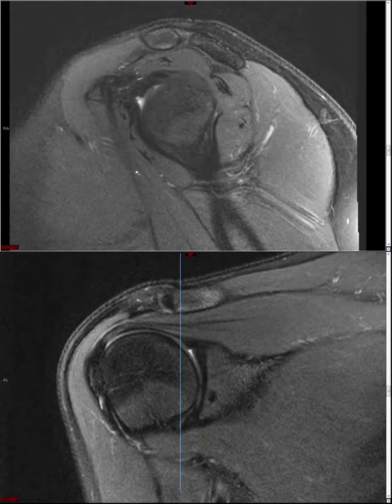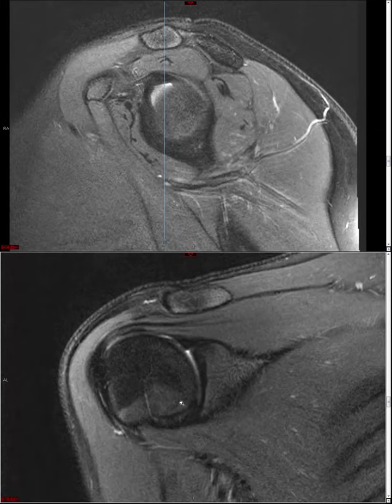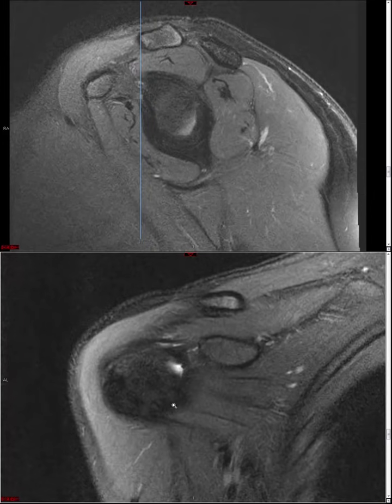with the subcoracoid bursa. Another good explanation is someone attempted an arthrogram, and so as I was saying, you put your needle down on the medial humeral head, but let's say you didn't have your needle right down on bone and you're actually a little more superficial than it should have been, then quite conceivably you deposit a whole bunch of contrast into the subcoracoid bursa rather than going into the joint. And how that would look on fluoro for those of you who are about to undertake shoulder arthrography is you put your needle down, you think you're in, you inject, and you just get this blob of contrast that just kind of surrounds the needle there. That's a pretty good look for a subcoracoid bursal injection.